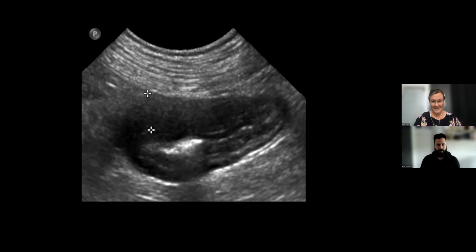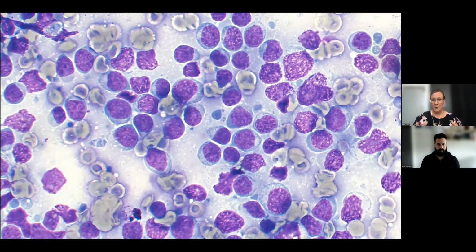Well, we had a very diagnostic sample, so good job on getting your sample. These can, I know, be challenging to aspirate when the intestinal wall is not very thick, when you don't really have tissue to exactly aim for. But in this case, we got a very nice diagnostic sample, and that is what we're going to take a look at. So here is a beautiful photo of the cytology from a representative aspirate.